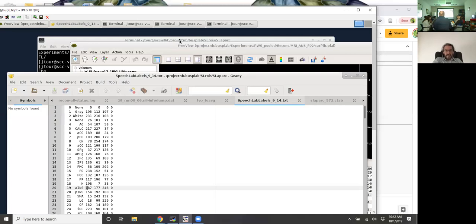What's convenient is the annotation files. They're just embedded in there. At the very beginning, if you're just creating a labeling system, you need to have that color table, and you say, okay, label these vertices with this, and assign each region a value.